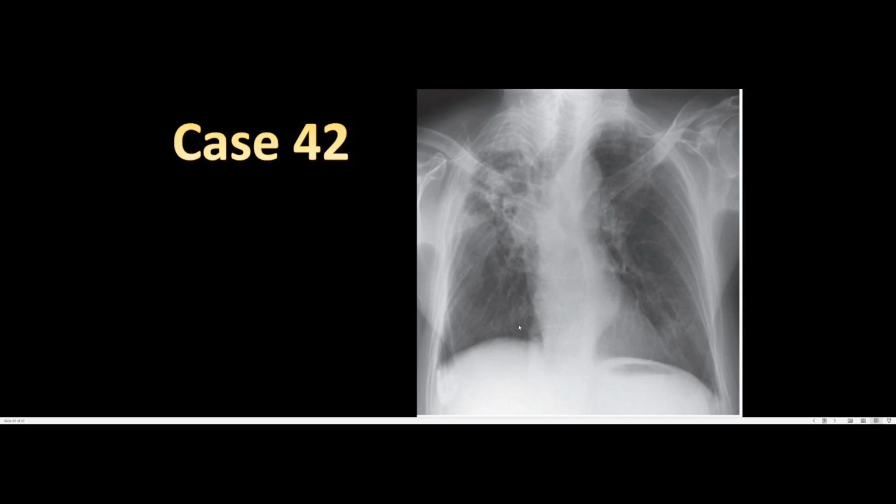We can see a case of interstitial lung disease, suggesting that we have multiple cystic lesions or multiple cavitary lesions. They could be in the form of a honeycomb appearance. They might not, but we're going to assume this is a case of interstitial fibrosis within the right upper lobe with deviation of the trachea.